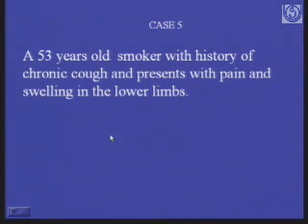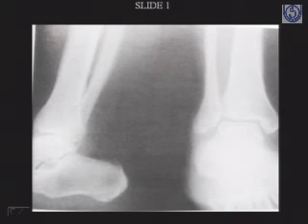When the patient presented in the orthopedics department with pain and swelling in the lower limbs, the first thing they got was an X-ray of the lower limbs. So this was the X-ray which was taken of the lower limbs. I would like my resident doctor to kindly comment on this X-ray.